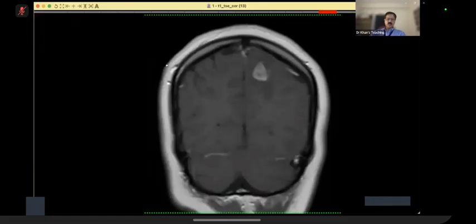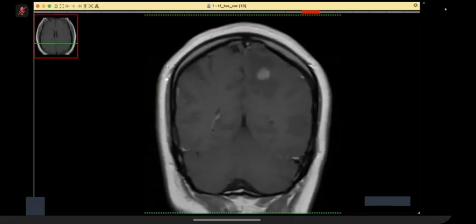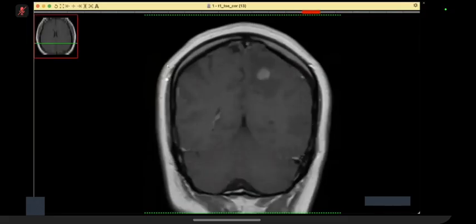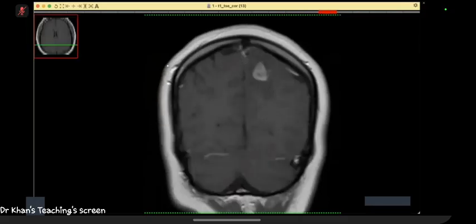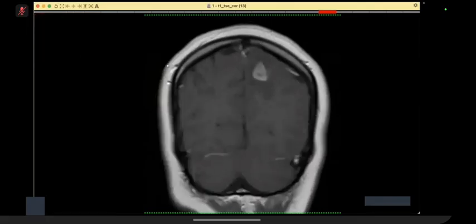So, conclusion, does anything else come to your mind? You have pointed out lymphoma, ruled that out slightly, and TB, you have ruled that out. Anything else? Well, if you look at everything individually, I would say it could be a primary brain tumor with surrounding edema. However, I cannot link it to the abdominal or mediastinal lymph nodes, to be honest. Right. Okay, thank you very much. You did very well. The thought process was good.